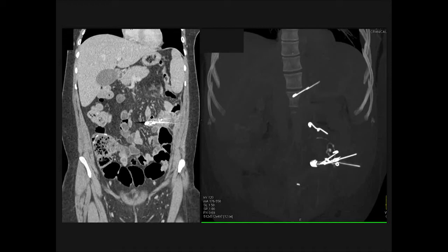And this patient swallowed a number of safety pins and opened the safety pins before they swallowed them. And all of us do see occasional cases of patients who swallow things, and this is one of the more dramatic ones. And obviously, these are not going to pass. The question is, what do you do? Do you go in and operate? Can you make more problems than you solve?